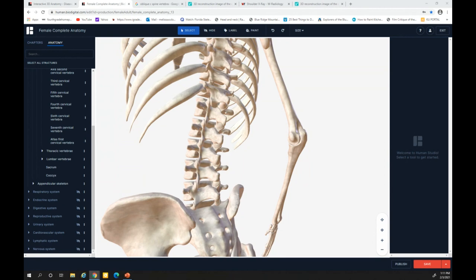So what we're seeing is the dog here. I don't know if you can see, here's his transverse process and his superior articular process here. That would be his ear. This is the inferior articular process, his leg. And in this area where it looks shadowed, that would be where the pedicle sits.